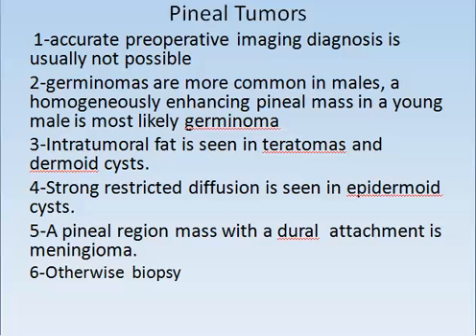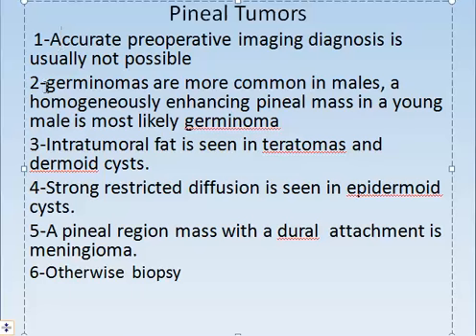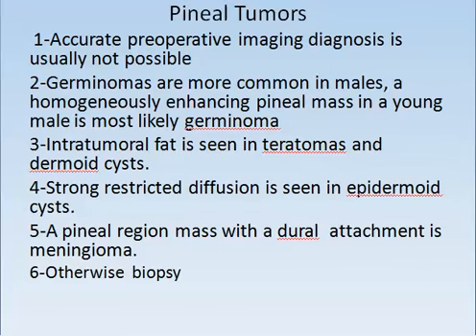So we have germinomas, teratomas and dermoids with fat, the restricted epidermoid, and the dural attachment of a meningioma. These are the main lesions of the pineal gland.